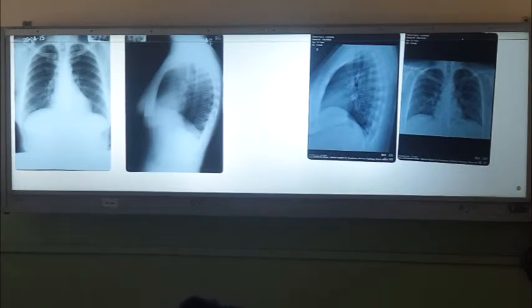The other thing is, there are various terms used by radiologists, right? Homogeneous opacities, ill-defined opacities, well-defined opacities, then cavitating lesions, consolidation, miliary shadows, nodular opacity, like that. The radiologists use various terms, and some of these terms have a meaning. If you say consolidation, there should be an opacity with air bronchogram. I will go through the other X-rays; I have enough examples.